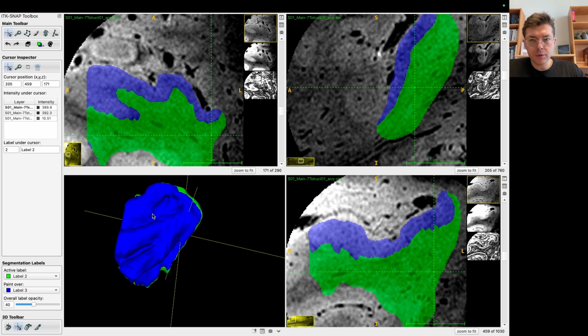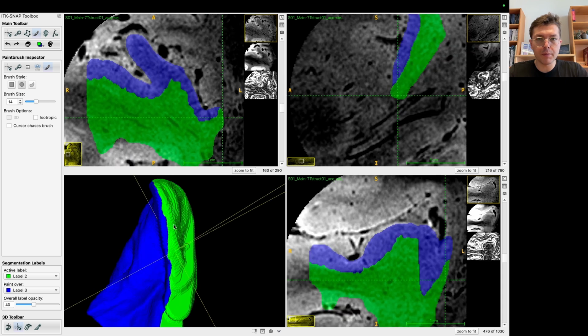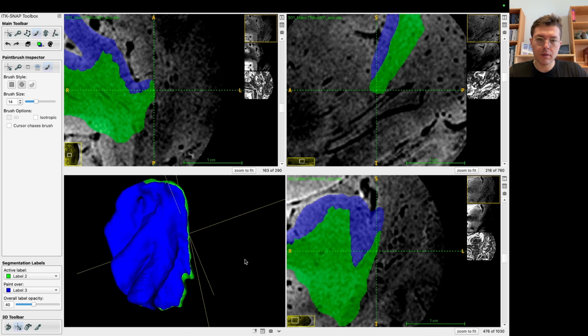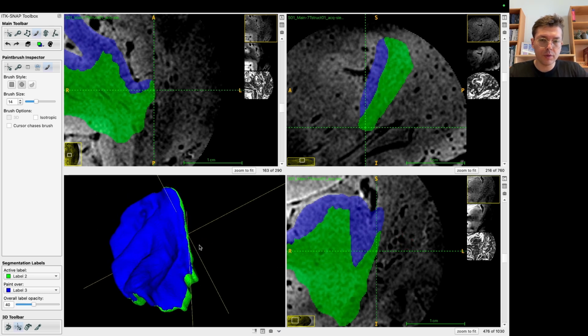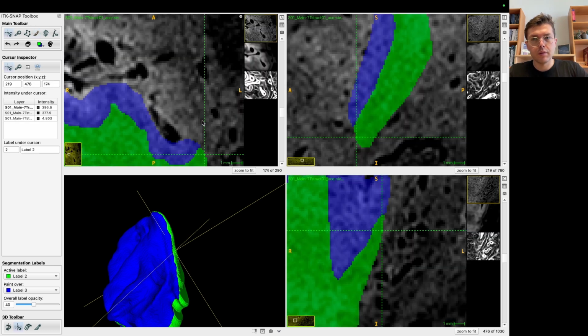So now I'm planning to basically analyze a disk around here. Yeah, I was saying that probably I need a bit more around here to segment. How can I best get that? Actually, I'm not sure if we need it or not.